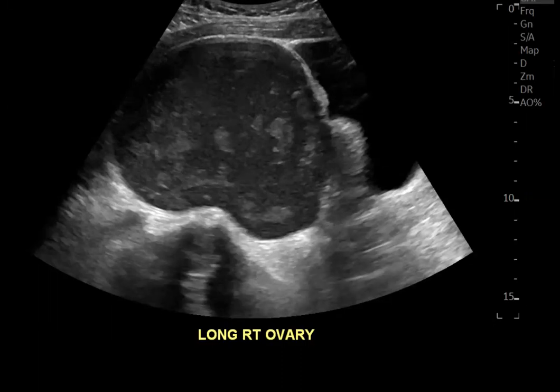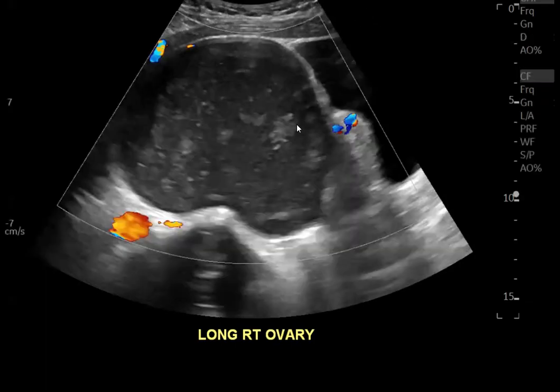And they don't show any Doppler signal within them. There's no vascularity within them. And that's how you distinguish them from malignancy developing in an endometrioma. And of course, if there is malignancy developing in an endometrioma, this ground glass-like appearance will be replaced by anechoic fluid because of hypersecretion of fluid from the malignant nodules into the endometrioma. And that also contributes to decrease in T2 shading within endometriomas when there is malignant transformation. So just some additional facts.